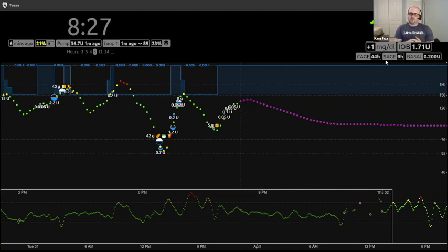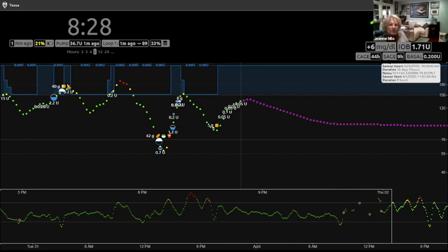These pills in here are pretty much all manual when it comes to age things. Tracking how long things have been around is all manual at this point. There are shortcuts that you can use on the iPhones themselves to log some of these in Nightscout. Sometimes they end up being just notes, not actually triggering these pills, but you can take a look at those. I don't have an iPhone, just my daughter does, so I don't use the shortcuts a whole lot. If you forget to put in your Cage or your Sage starting point, you can do that at any point.